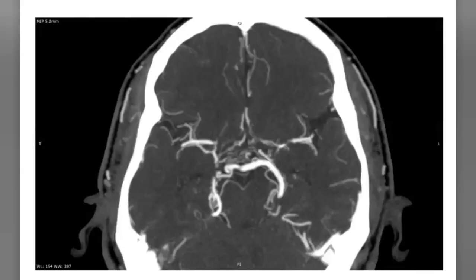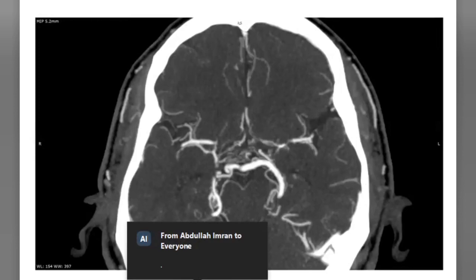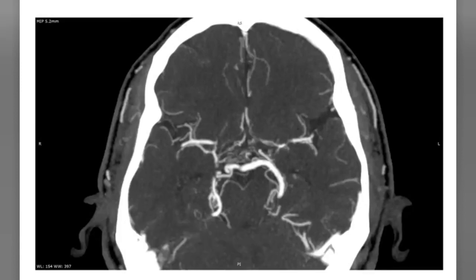The same patient with CT angiogram. I can't appreciate. Alright, it's okay. So these are just representative images. Of course these are sometimes difficult. I just want you to get a grasp of some of the spectrum of vascular imaging.